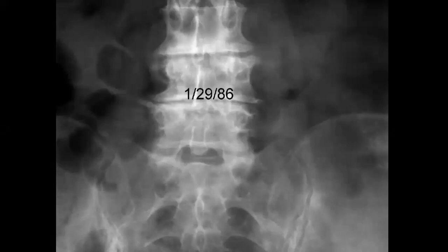Okay, let's go to the answer. Maybe you will think that there are osteophytes here and some degenerative disease. Okay, but what else? What should you see in the checklist that you will search for?